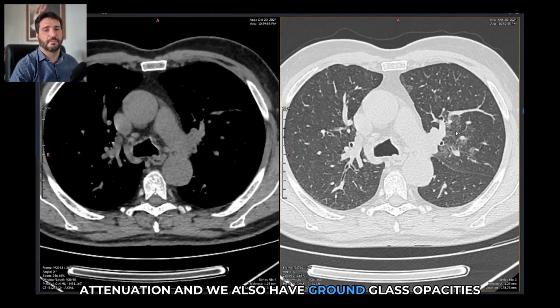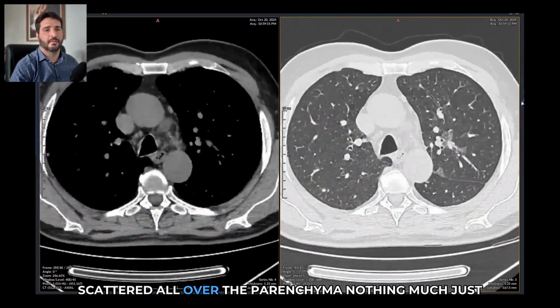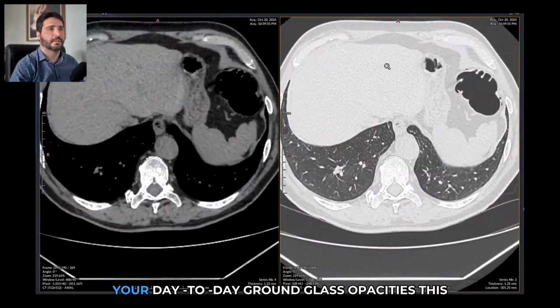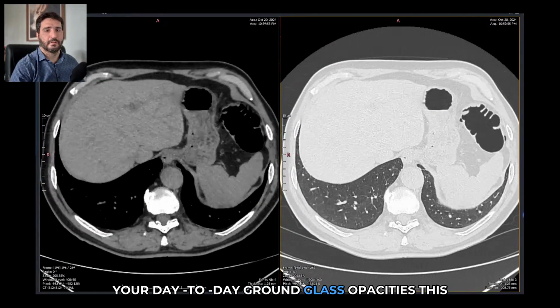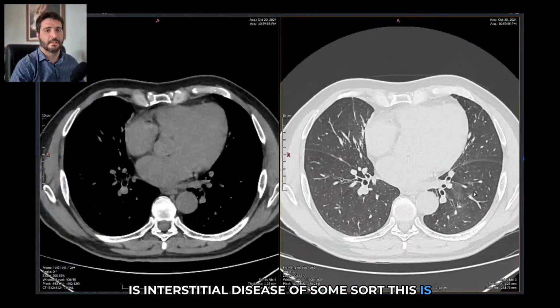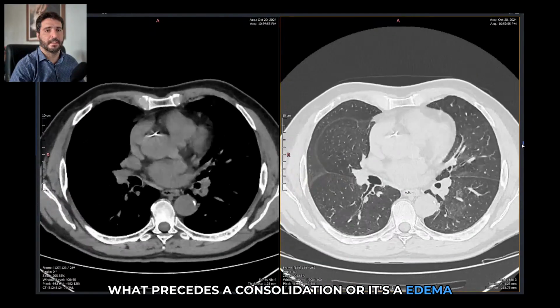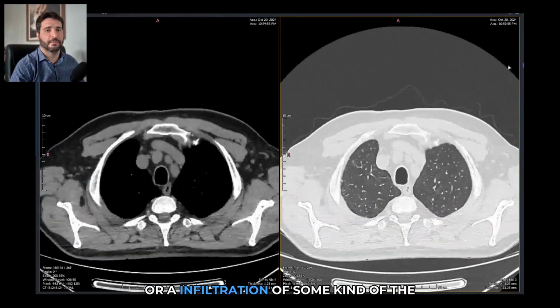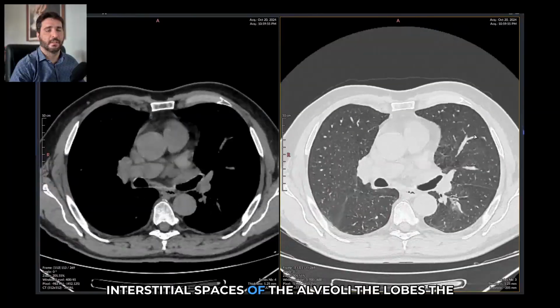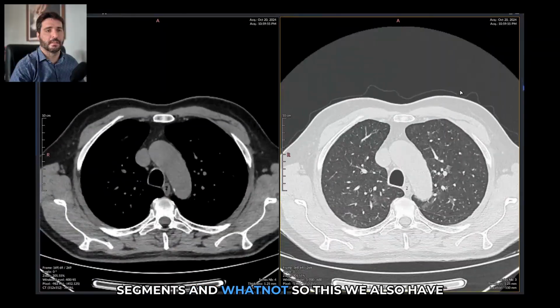And we also have ground glass opacities scattered all over the parenchyma. Nothing much, just your day-to-day ground glass opacities. This is interstitial disease of some sort. This is what precedes a consolidation, or it's an edema or an infiltration of some kind of the interstitial spaces of the alveoli, the lobes, the segments, and whatnot.